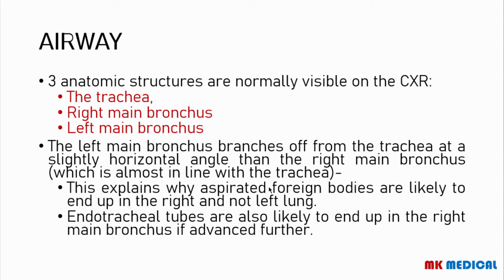So we'll begin with the airway. Remember that there are 3 anatomical structures that are visible on the chest x-ray.